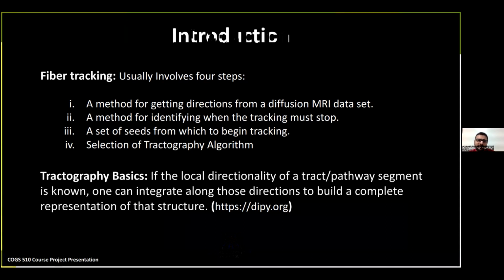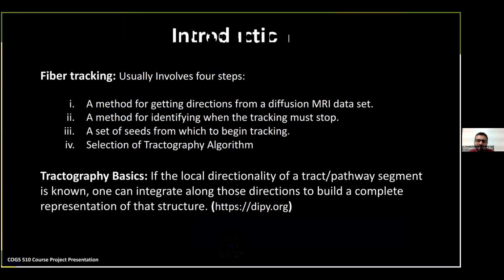The basic idea behind tractography is that given the local directionality of a tract pathway, you can integrate along it segment by segment to build a complete representation. So you can start from one point and put the directional tensors one after the other, which lets you reconstruct the whole directionality from one point to another.